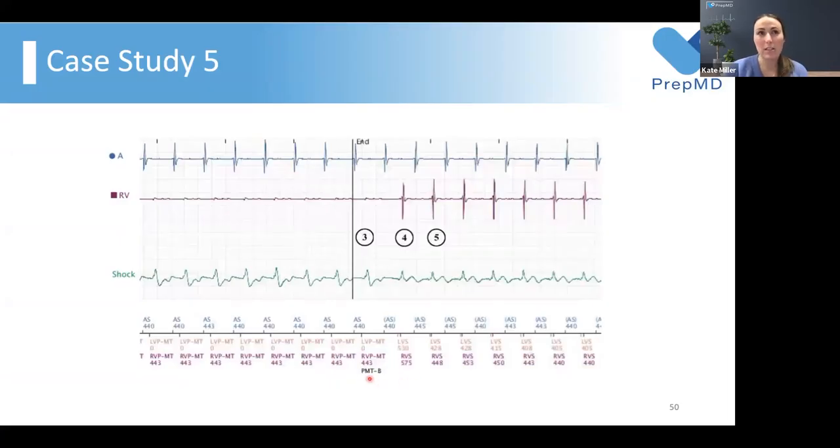So Mark, you want to take over with what happens here on this patient? What's going on? Yeah, absolutely. So again, 16 pacing at max track. On that 16th one, we see that our PVARP is extended. So we have that A-sense falling into refractory, and we're no longer tracking it. Now, this patient's interesting because we're not tracking the A-sense, but their intrinsic conduction actually kicks in here. So we have A-sense in refractory followed by RV sense and LV sense right there. Now, the next atrial beat, if you look, is still in refractory.